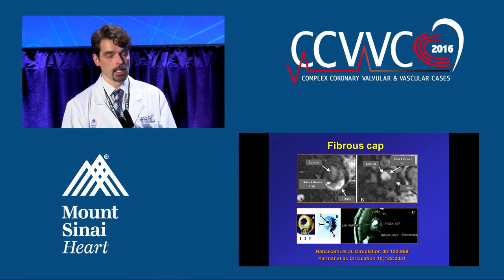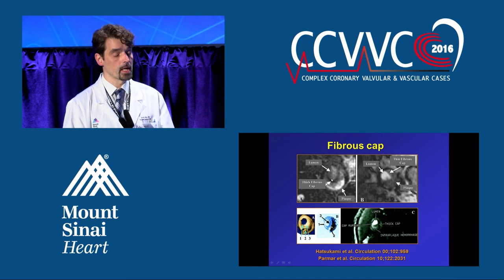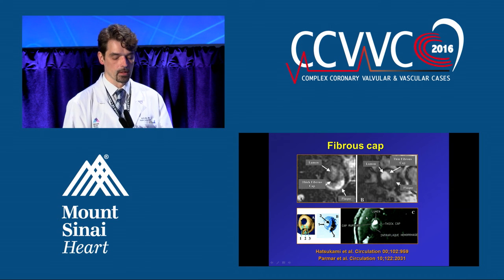We can get an idea of the fibrous cap, and this is an example of 2 plaques. This is one with a thick cap, and this is one with a thin cap. Now, the thickness of the fibrous cap, what is a thin fibrous cap? It's less than 65 micrometers, and the resolution of the MRI is not that good, so we cannot see it. But the thick caps, we actually can see them sometimes. So you see this dark line here, this is a thick cap. When you don't see it, this is consistent with a thin cap. So it performs reasonably well when it's compared with histology.